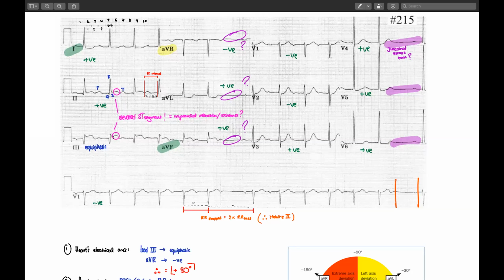If you remember when we discussed the right ventricle MI, we said that the ST elevation is the highest in lead 3, and after that AVF and 2. So possibly this patient could have a right ventricle MI as well. But we don't know, because we don't have any kind of right ventricle lead. Okay, let's go on. So here it's indicating that we do have an inferior acute MI.